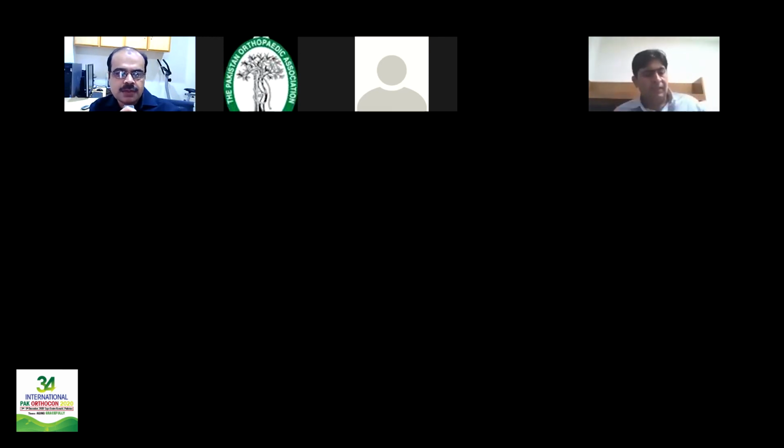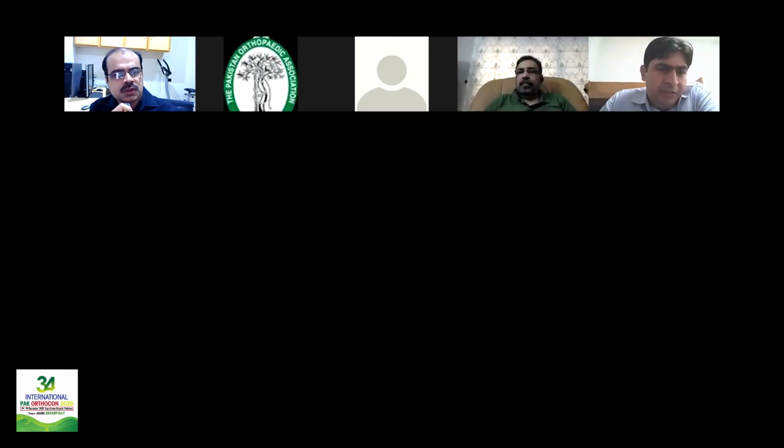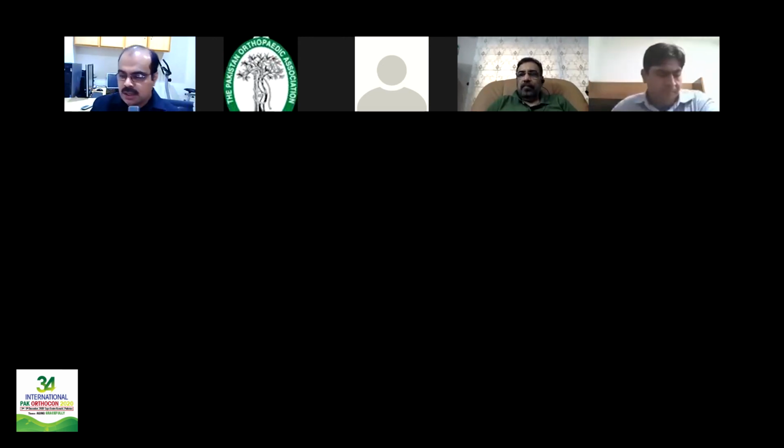A combination, basically. Okay, and one more question is regarding the grading of the tears. How do we grade the tear, and especially how do we differentiate whether it is reaching up to the articular surface or not? Okay, so in this way, I will show you the image discussed earlier. Yes, we can see the screen. Okay, so now the tear is basically like this, this is the meniscus.